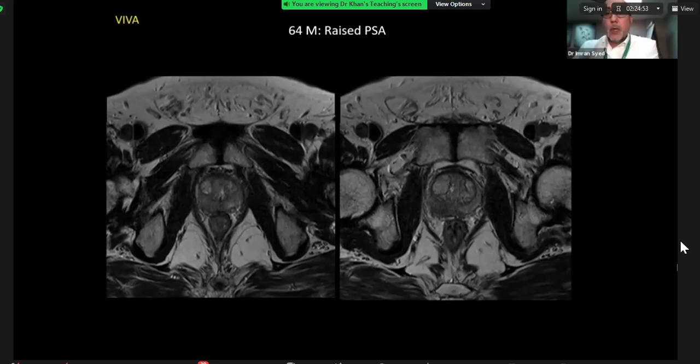Okay, good. So in essence, we've got a T2 weighted axial small field of view image, and as you say, there is an area of nodular change seen in the right peripheral zone base. The nodularity and the low signal change that you can see is at the 7 o'clock position, so it's well worth getting a clock face if you'd like, similar to the perianal fistula imaging that we use using a clock face. So use that. That's 7 o'clock.